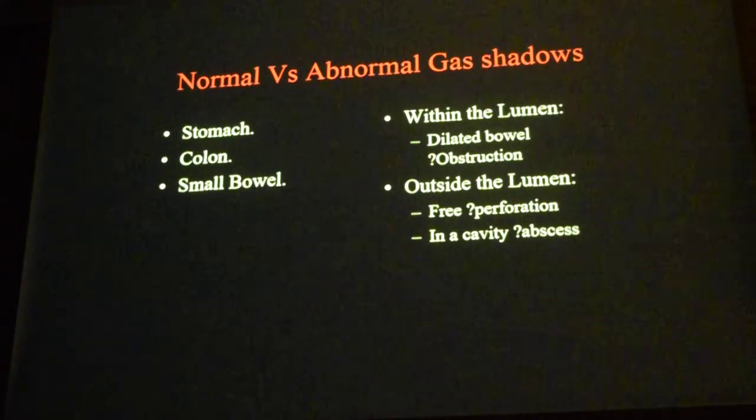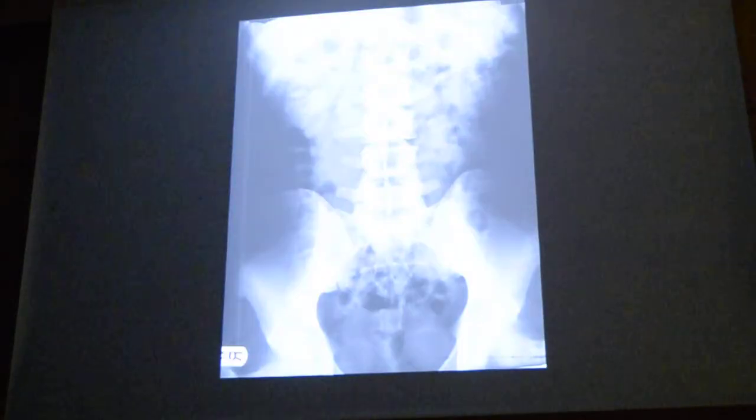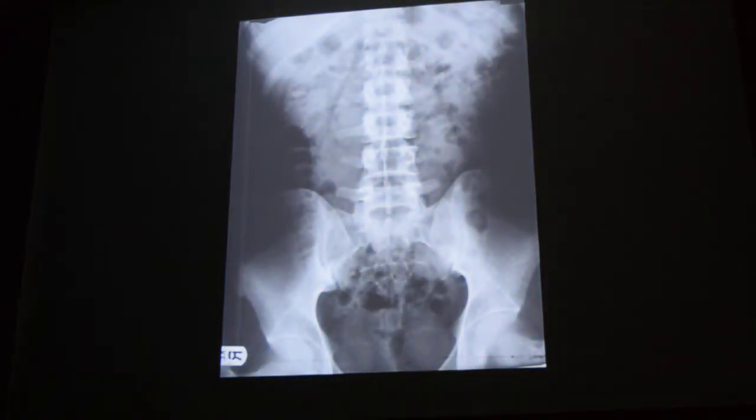Excuse me, could you go to the previous picture? So the black area there, this is normal. Yes, this is normal, this is all normal. Why? Because we haven't prepared the patient. We haven't got rid of the gas shadows which are obscuring the system.